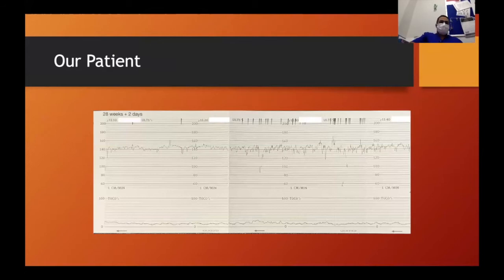Now, the CTGs are presented so that they're anonymized. There's no patient information, there's no signatures, so there's no staff information. You can see there's no date either. Okay, so there's no way of actually knowing where this CTG comes from, even which hospital. Nothing that can identify the hospital, the staff, or the patient. Okay, and we look at the previous traces.